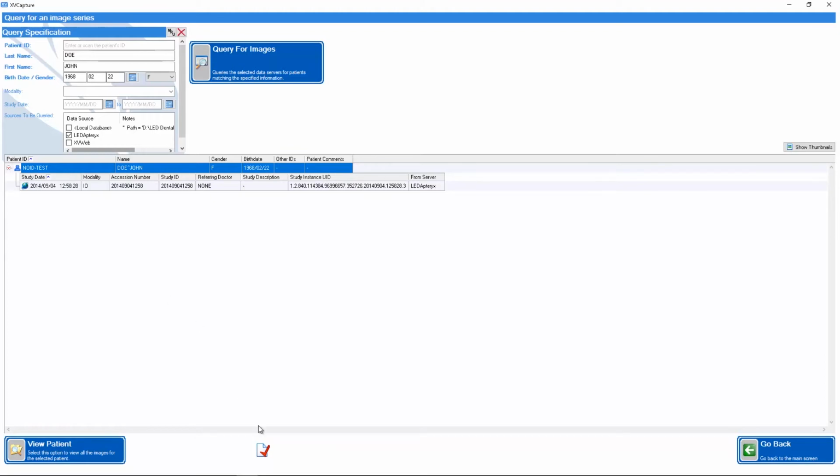Once the name is highlighted, we're going to come to our data correction checkbox here. We're going to click that. It's going to let us know that it won't allow us to do that until we download the images, so we're going to store those locally.